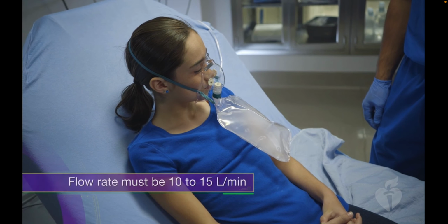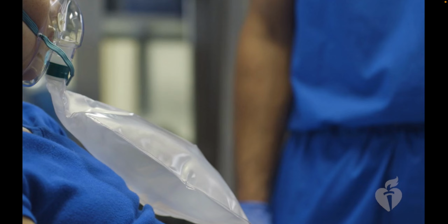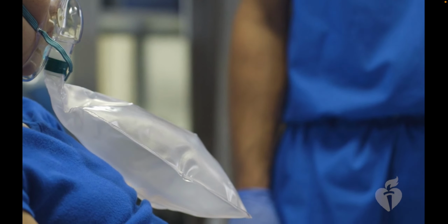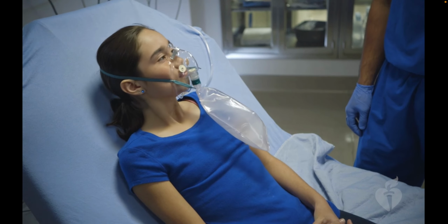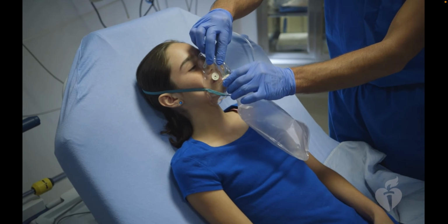Non-rebreathing face masks are always connected directly to oxygen. The oxygen flow rate for the mask must be at 10 to 15 liters per minute. The flow rate should be adequate to keep the reservoir bag partially expanded. If the mask is tight-fitting, one-way valves ensure the child breathes only oxygen from the oxygen source or the reservoir.